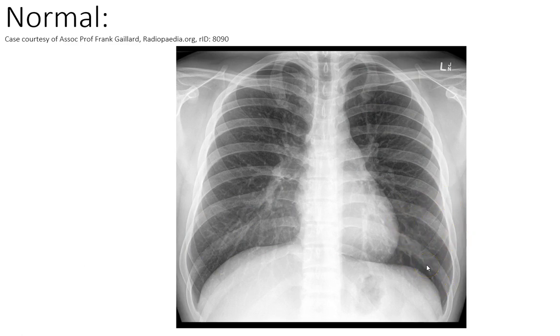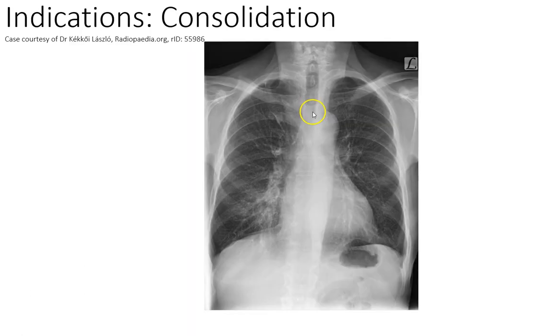Now the things that we see that are significant is when we're thinking about physiotherapy, we're thinking about indications and contraindications. So I've gone through my strategy, my approach for how I look at a chest x-ray. Now I'm going to take that through onto some films with some abnormalities. So the first thing that a physiotherapist looks to treat is consolidation. And so what I did was I did a Google image search just of consolidation and chest x-rays. And these are some of the films that I was able to gain.